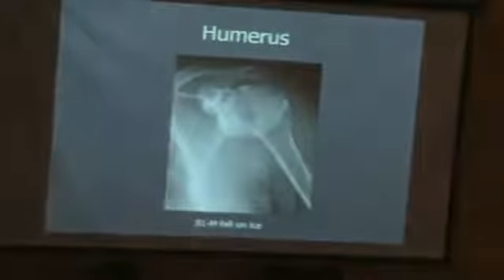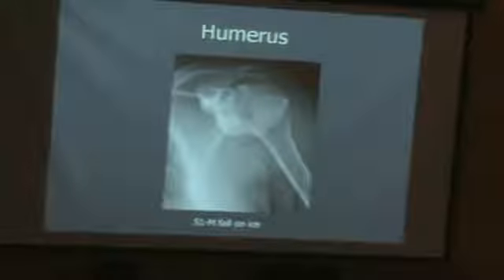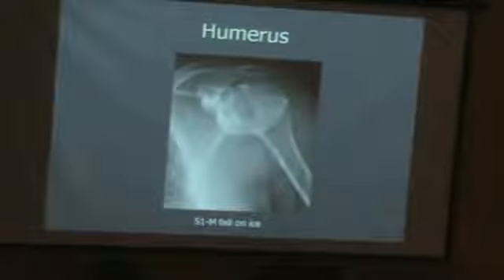Now, this is a patient who came after a fall on ice. We get the radiograph. Unfortunately, I could not actually fetch it. He did it in another hospital, but the radiograph was normal.